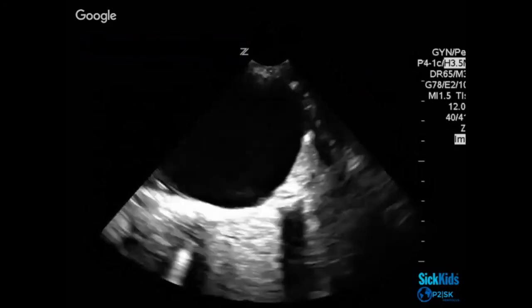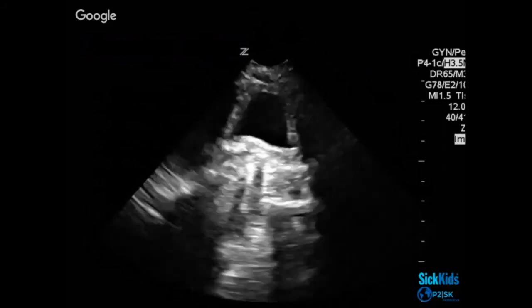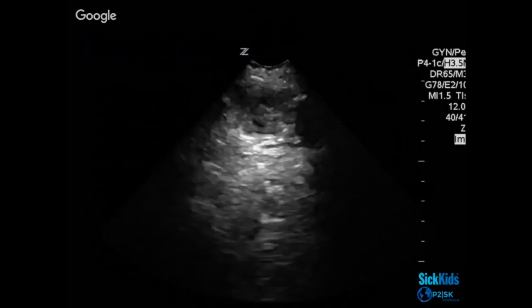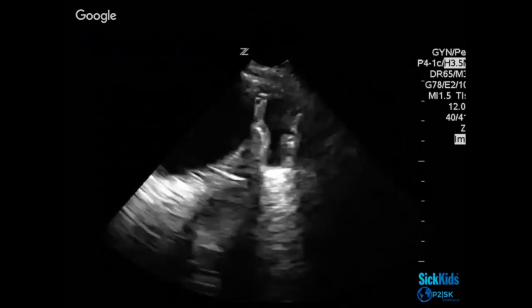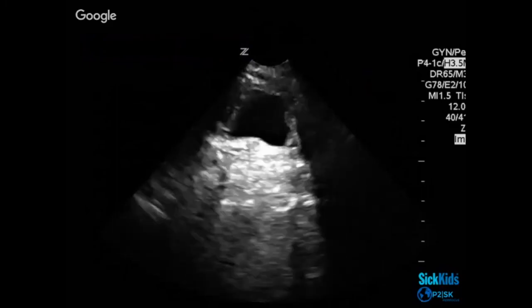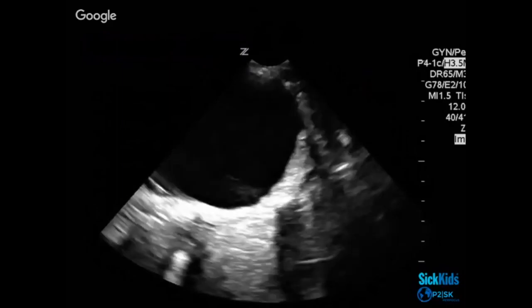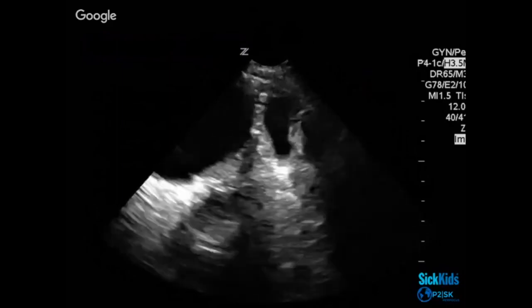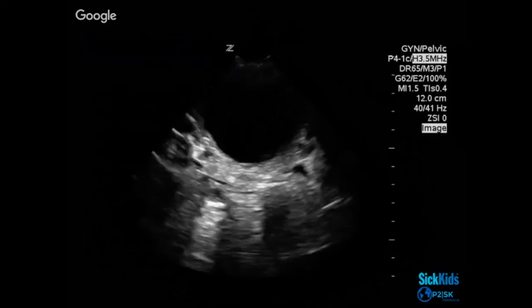But the important thing to think about is that it could be either, right? It's really hard to tell in a very distended bladder. I think the odds are what this patient had was the large cyst and then the smaller bladder because they'd probably just voided. But it's important to really anchor yourself in trying to identify those different factors because it can get tricky.